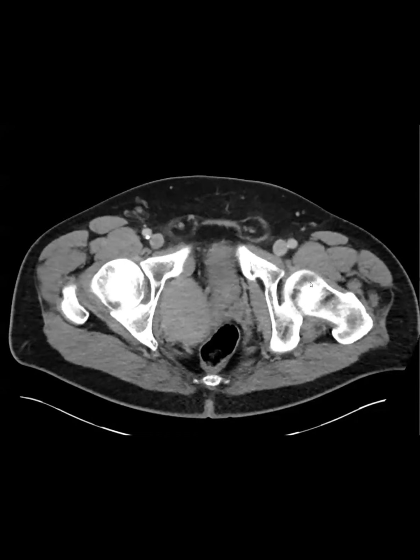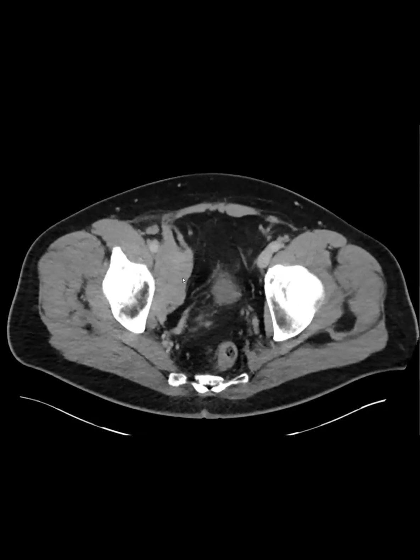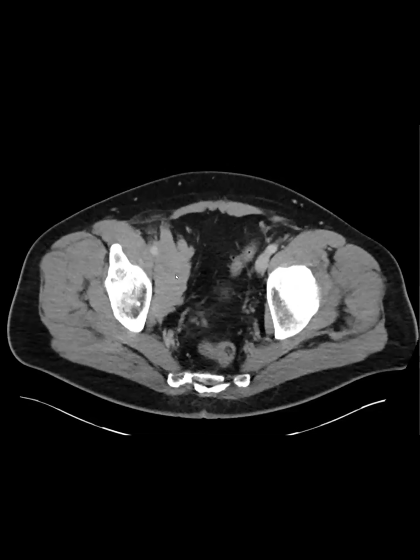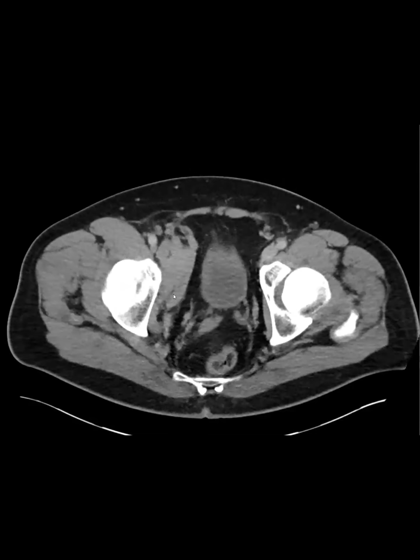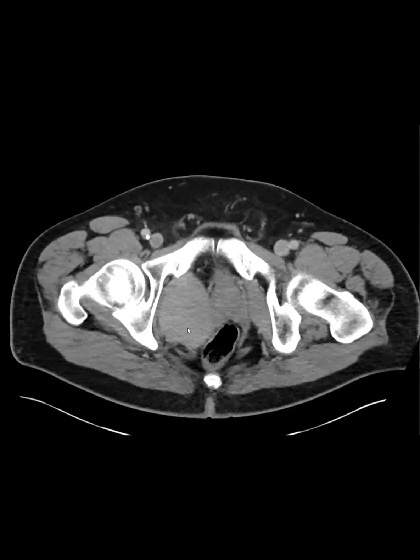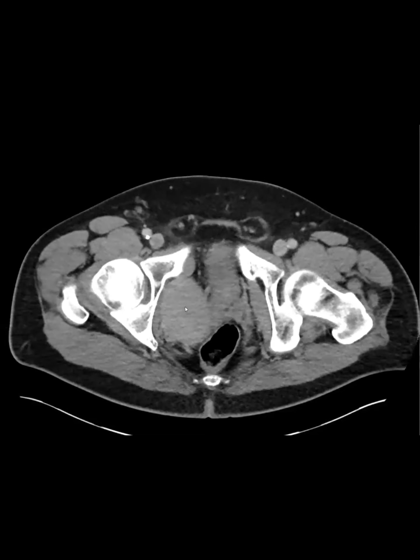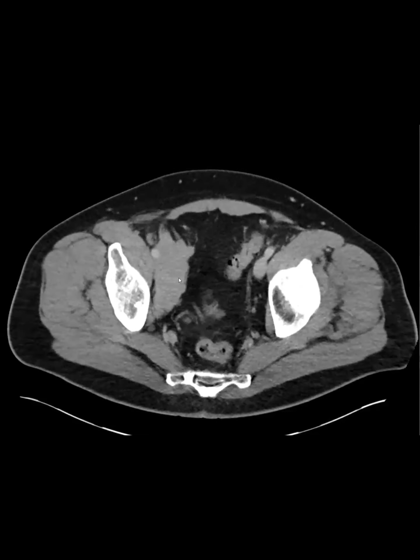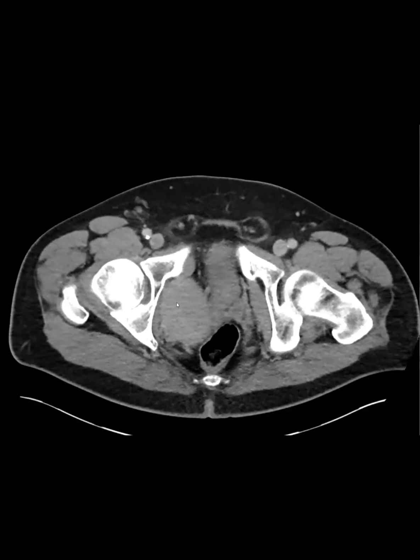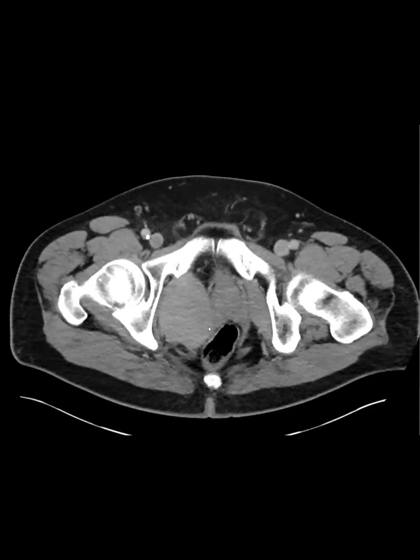Some kind of lymphoma. Okay, so you're seeing a pelvic sidewall mass. It's kind of blobby and homogeneous. I'm assuming that's why you're thinking about lymphoma. It looks like it could be a huge nodal conglomerate, and it looks pretty homogeneous. It's extending almost through fascial planes because it's in the pelvic sidewall, but also going down into the ischioanal fossa down here. It was not lymphoma.